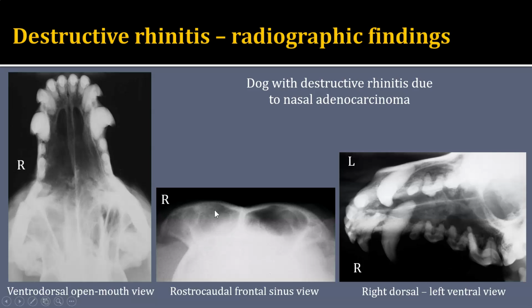And so that tells me that this soft tissue opacity has to partly be the mass leading to lysis, not just fluid. We obtained an oblique view of the nasal passages in this patient, and this oblique view just depicts all of this lysis of this palatine and maxillary bone, both on the right and the left side. Although it is around the teeth, this is much more extensive lysis, and in light of the mass that we identified in the frontal sinus lesion, it is unlikely to be just from dental disease.